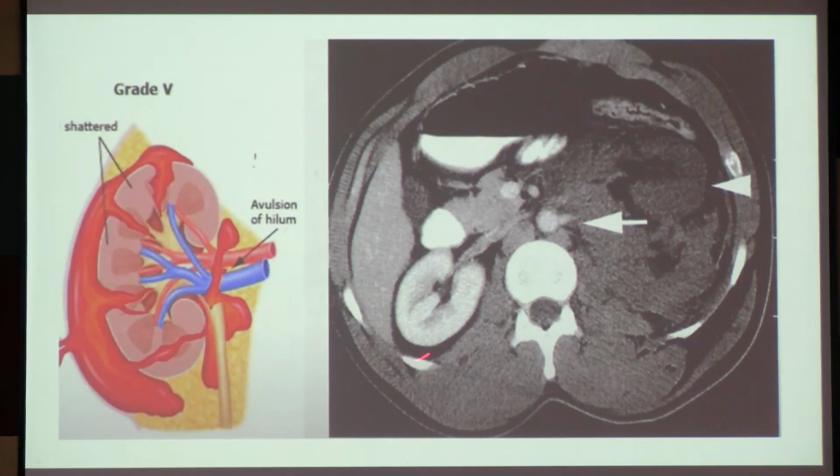This is the normal side kidney. This is the liver outline, so this is the right side kidney. The right side kidney has taken the contrast well enough. Since the ureters do not have the contrast, this is the cortical phase of the CT scan. I am not going into details of CT scan today because that will be a next class imaging. But I am just giving an idea that this is a normal CT scan of the right kidney.